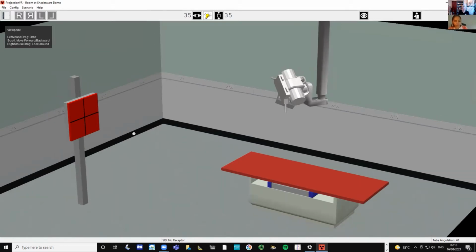Now, we need some more tools to be able to take an X-ray, and they're found along this top bit here called the tool ribbon. If I click on this top left corner, that's our receptor selection, and we can choose large and small receptors. I'm going to pick a small 24-30 centimeter receptor without a grid. I've got a choice of with a grid, 8:1 parallel, or without a grid, so I'm going to pick without a grid.